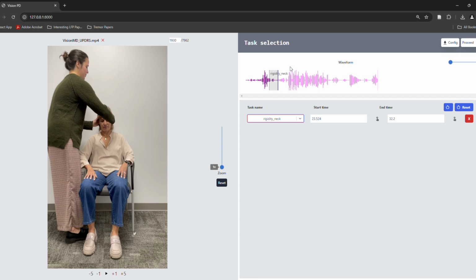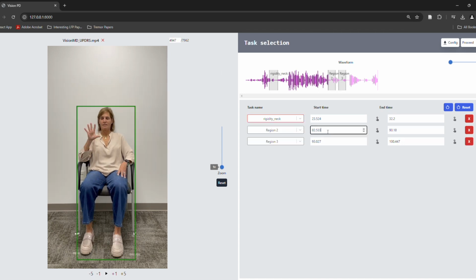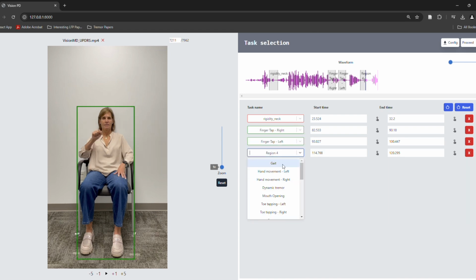You will repeat these steps until you have selected all parts of the video that you want selected as a task. Another way to label is by typing it in and looking through the previous labels already set. Additionally, you can scroll through the current option menu.